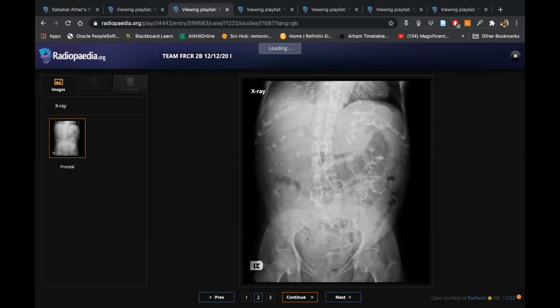So you gave me two differentials here, right? One you gave as peritoneal disease, that there are some peritoneal nodules which are calcified. Is that so? And the second, if I remember, was infection, right? Yes, like TB. Those are reasonable differentials for sure. But let me say that there are no calcified nodes and there is no peritoneal disease. And the patient has a genetic disease. What will you think of?